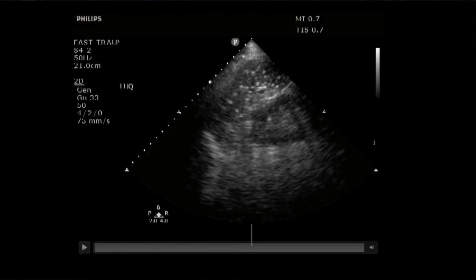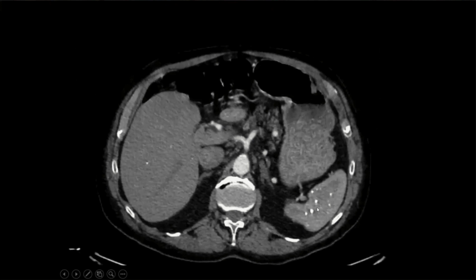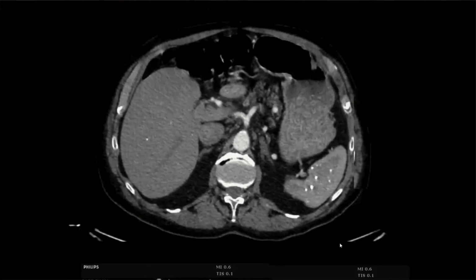Coccidio. It's actually not the stomach because the kidney is down here. So this is actually the spleen, but that's a really good point because you could think there was something, air bubbles in the stomach, and we'll get to that. But this is actually granulomas. So you can see there's actually one in the liver here, and then there's a bunch in the spleen. So somebody who has sarcoid, or somebody who had coccidio or histoplasmosis. If they were in the southwest and they wound up with histoplasmosis, they can actually have these nice little granulomas in their spleen.